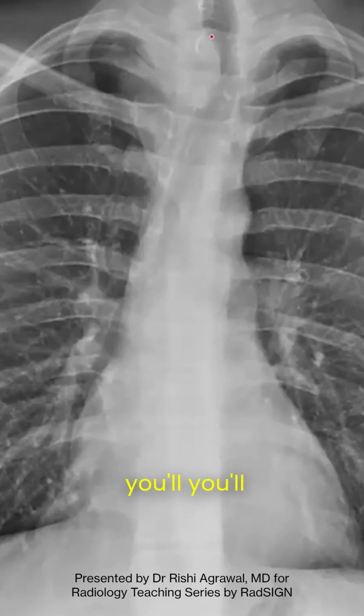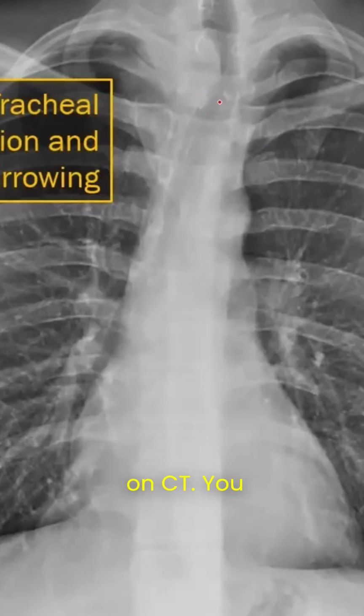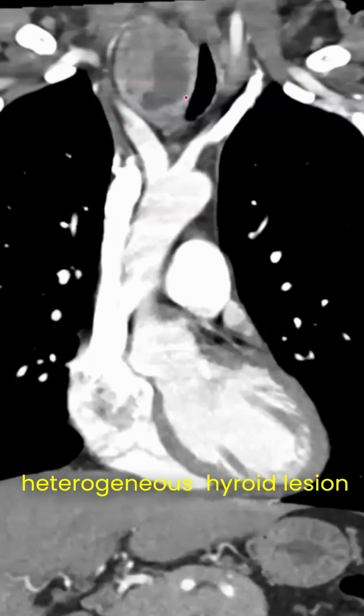And this one, you'll see this abnormality above the clavicles, and this is a thyroid mass. So here it is on CT. You have a heterogeneous thyroid lesion.